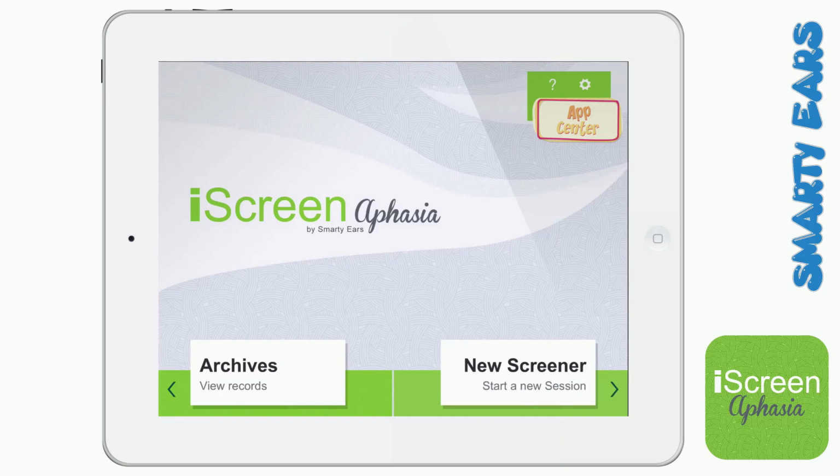Welcome to the video tutorial of iScreen Aphasia. This app was released by Smarty Ears. I'm Barbara Fernandez. I am the designer of this app. And we authored this app with another speech-language pathologist, and her name is Tiffany Wallace.